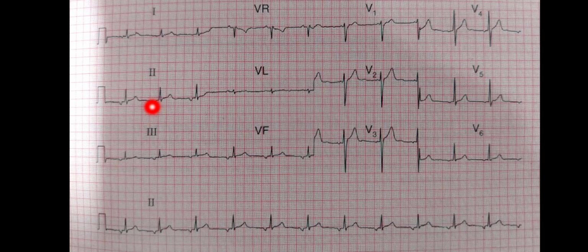So today's ECG, we start with the rhythm by looking at the P wave in lead 2. There is a P wave in lead 2, but look at the morphology. It is not a normal morphology of the P wave. Usually the P wave is upwards in all the leads except lead aVR, but here you can see that we have an inverted P wave, which shows that this is not originating from the SA node, rather it has an ectopic focus in the atrium.